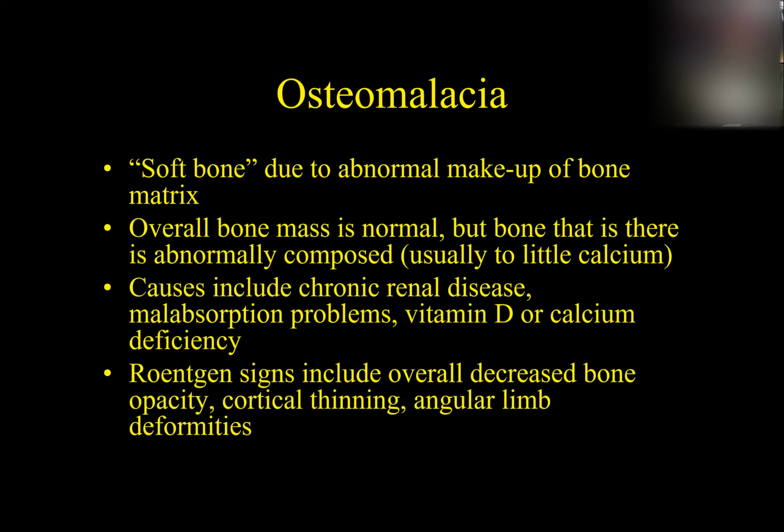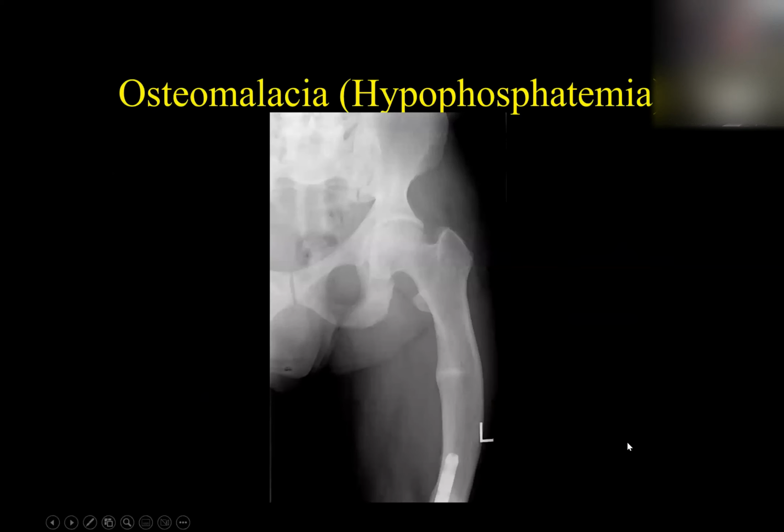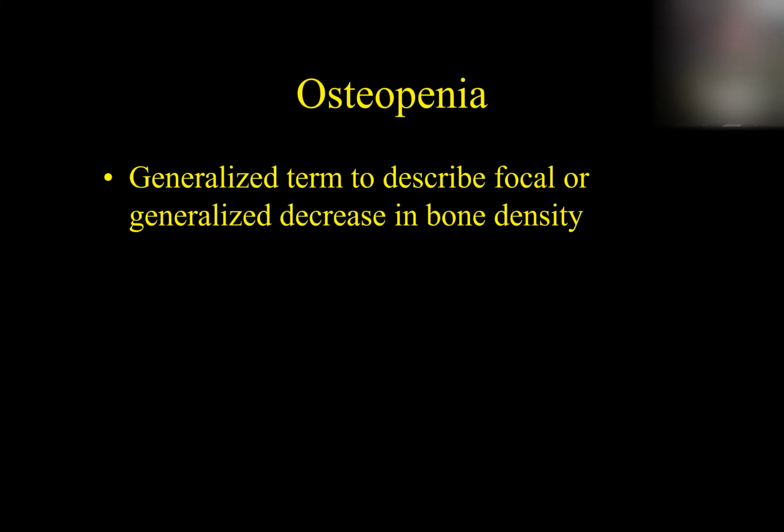or calcium deficiencies. And again, we hardly ever see osteomalacia nowadays, at least in this country, in dogs and cats. And sometimes you'll see it in wildlife if the owners don't know how to nutritionally support the wildlife, or in birds and things like that. So we can see some osteomalacia, but it's pretty rare. This is an example, a human femur. It's just kind of crooked in here. He's got some other issues and previous surgery. But anyway, that's caused by osteomalacia, kind of rounded or bendable, not as hard bones.